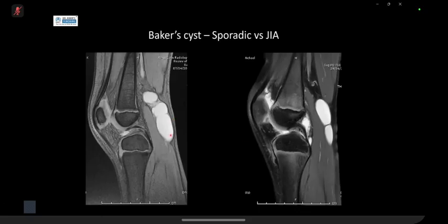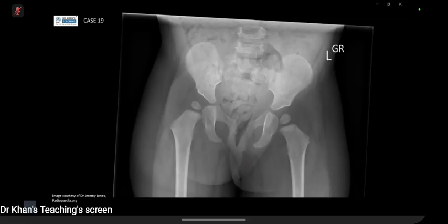And 2 different patients, and you can see that on this one, you've got synovial thickening, and synovium on MR on T2 is these low signal frond-like bits that coat the joint capsule, the joint space. That's basically an inflammatory process driving this Baker cyst production, versus one that has mostly joint fluid within the Baker cyst, but none really in the joint space, and no evidence of synovitis. So I think this is just to let you know that if you do have a Baker cyst, although it's reported, just make sure that there's nothing else underlying that's driving it. Okay, next type of case.